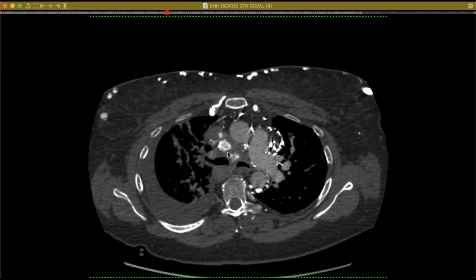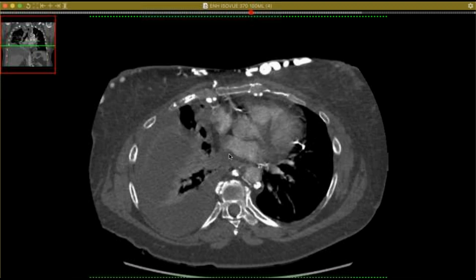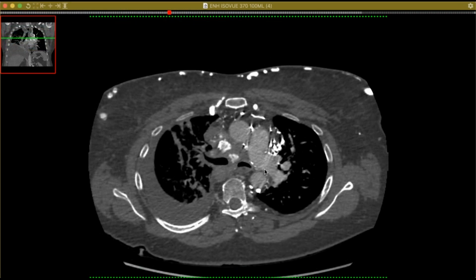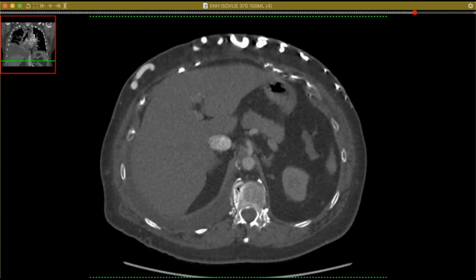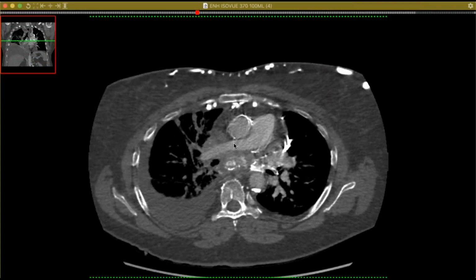It's in this big mass here. So this is a nice example of fibrosing mediastinitis. And you see a lot of collateral flow retrograde through the azygos. And in this case, the accessory hemiazygos is filled up because I think the azygos is out. And then branching down here and going up to the abdomen, paraspinal everywhere. So this is presumably from histoplasmosis, a Midwestern patient.